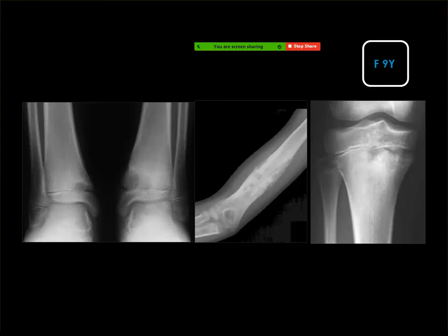The humerus looks like infectious osteomyelitis. Okay, apart definitely from... you should consider all as infection, because you don't say that the patient had inflammation of the other lesion. Sorry, what do you say? The other lesion I think it's neoplastic, but the humerus I don't know. It's mixed, this sclerotic lesion. This lesion you mean? No. The humerus. The humerus is infection or tumor? I think it's neoplastic.